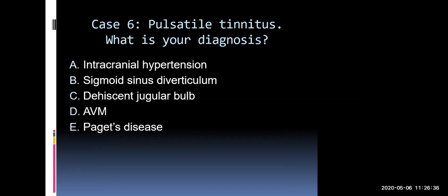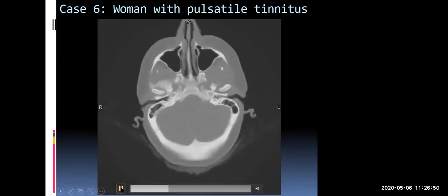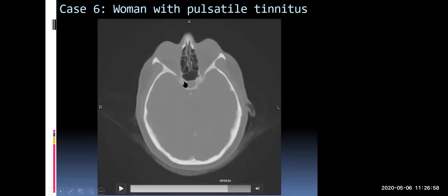So this patient actually has intracranial hypertension, and it is so bad that you can actually diagnose it on a CT scan. It's unusual to be able to see an empty dilated sella so beautifully on a CT scan, but I'm going to take you back up to that image right here. See that?